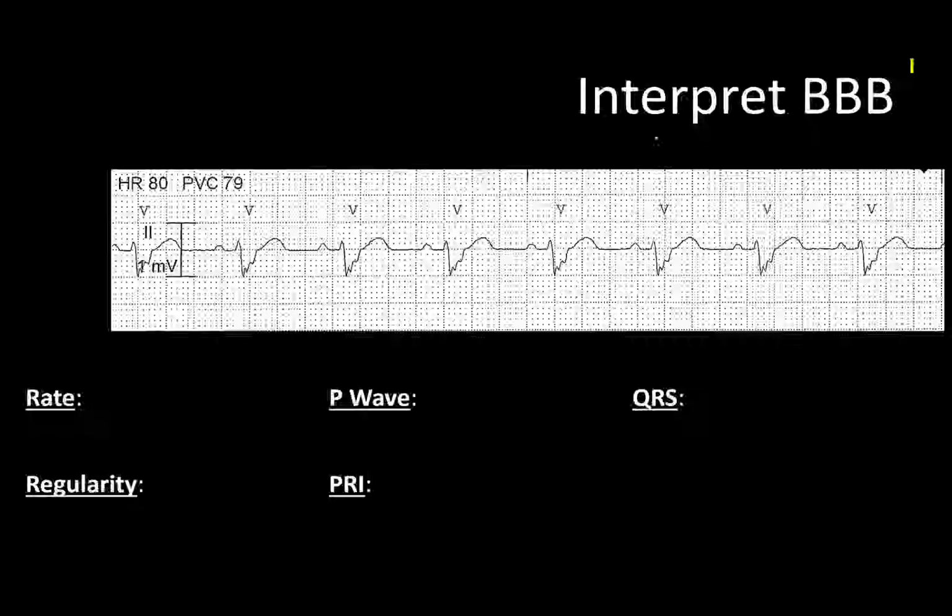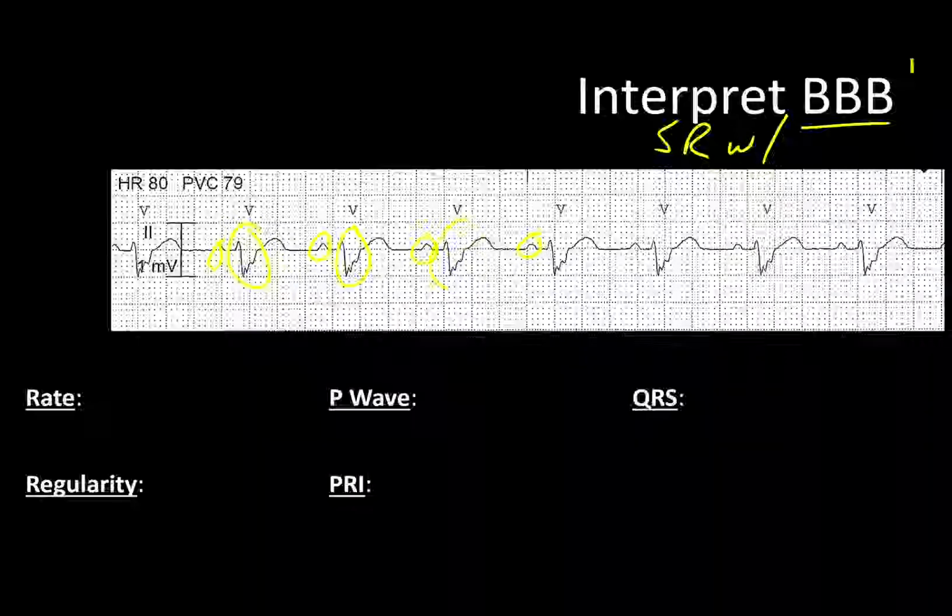What you have in front of you here is sinus rhythm with a bundle branch block. And so what makes it that? Well, you've got your P waves, they're right where they're supposed to be, and you've got one for every QRS, which is really good. But the difference is how wide that QRS is. And if you look at a lot of those other rhythms we've seen today, they're short, they're really spiky, kind of tight together. In this case, they're a lot wider.